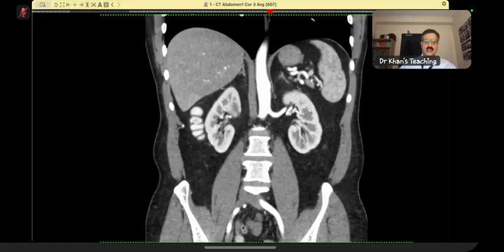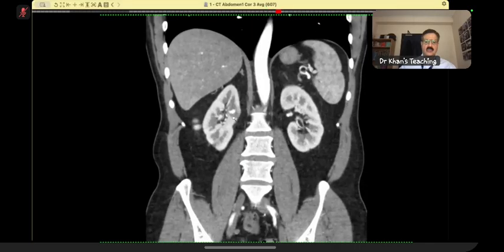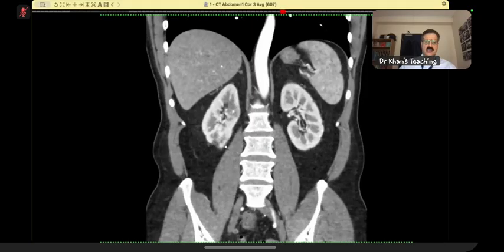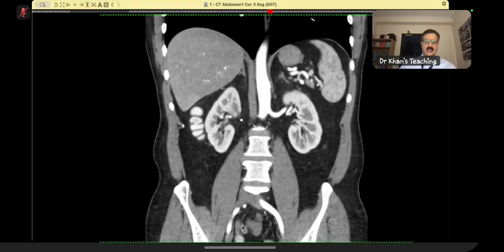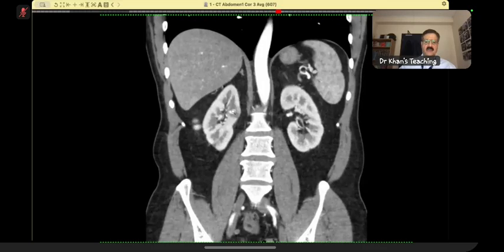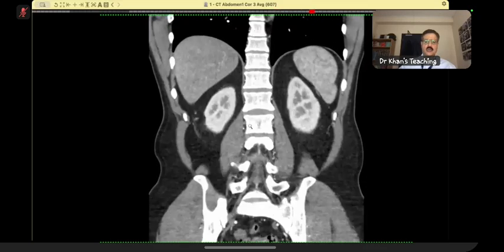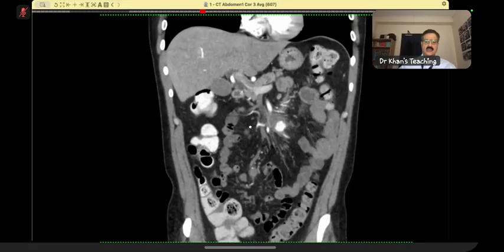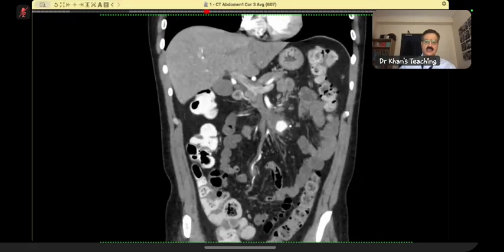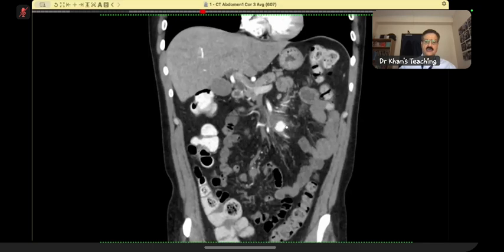So in this particular case, now you can see a small, tiny aneurysm, but this one is a definite aneurysm. You can see this irregularity, and you can see another developing hypodensity, which I had shown you on the axial. So there is another infarct there. So quite a few things happening. As far as the pseudoaneurysm is concerned, this is the pseudoaneurysm in the mesentery.